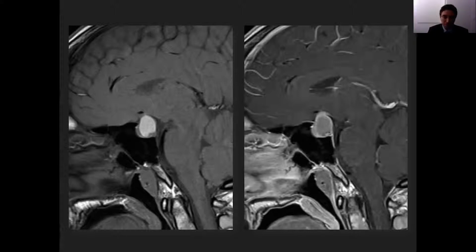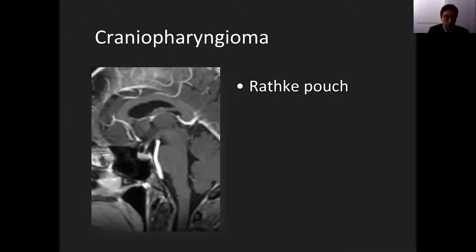So this is not a simple cyst. This is not a Rathke's cleft cyst for sure. And this is very suspicious for a craniopharyngioma in a child.